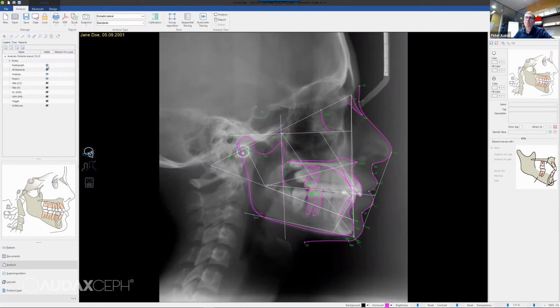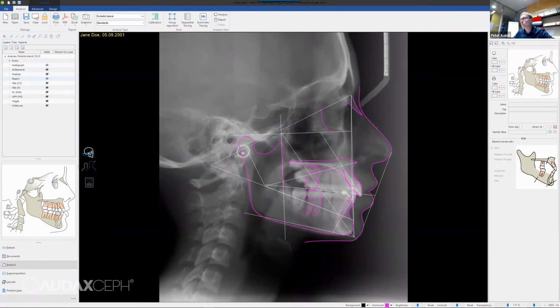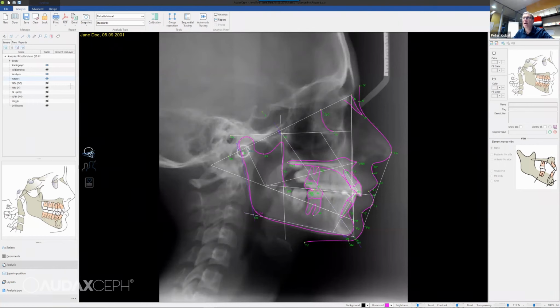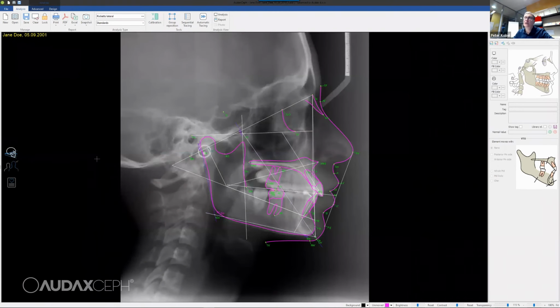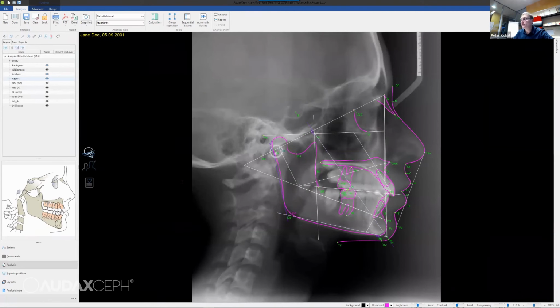So we changed icons for visibility as well. So now either we see it or we don't see it. These things are also here, so I can say, okay, let's make the analysis layer visible, or the report layer visible or invisible, so we can toggle these views here. And if we know what we need, we can make the user interface smaller, so there is more space on your screen. Click on this icon here, and it opens again.